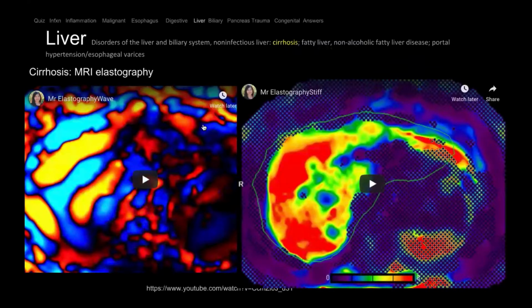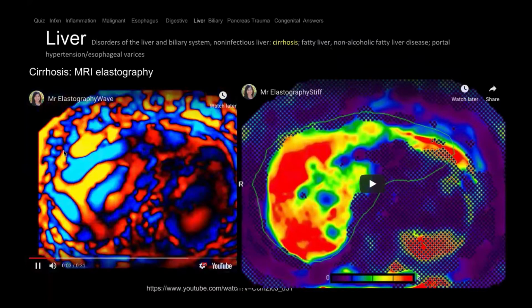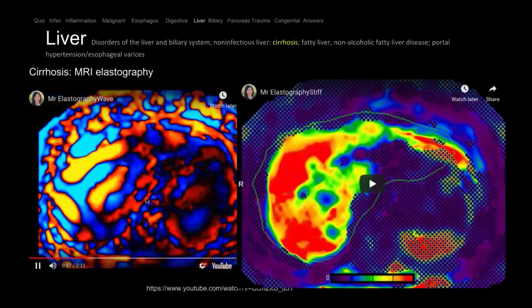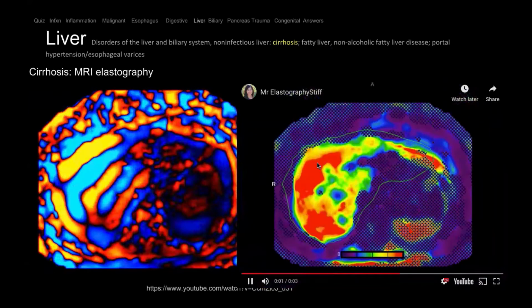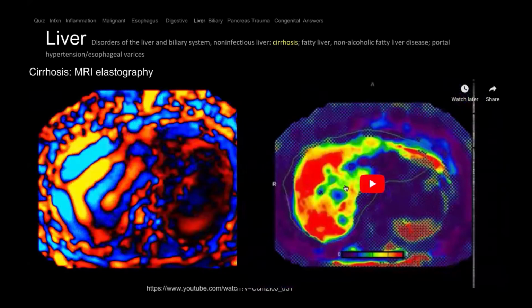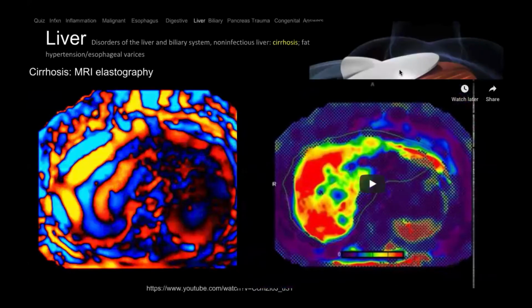Okay, so moving on. The best test for cirrhosis is called an MR elastography, which is what we see here. There's an external coupler that sends waves, and it's an MRI that's done. And then it generates an elastogram. The red parts are cirrhosis. The green are like stage 1, and the yellow are like stage 2, 3. This is the study of choice to assess fibrosis, cirrhosis.